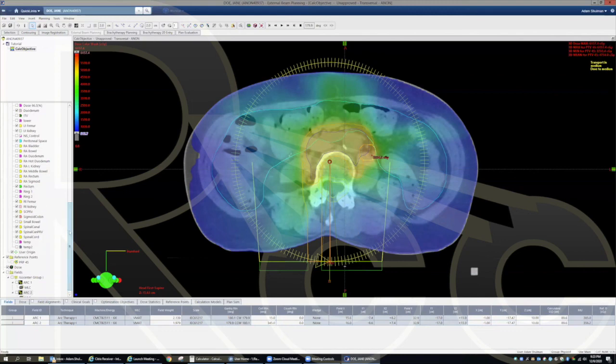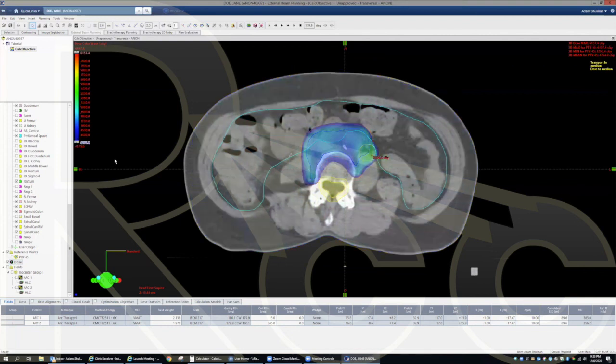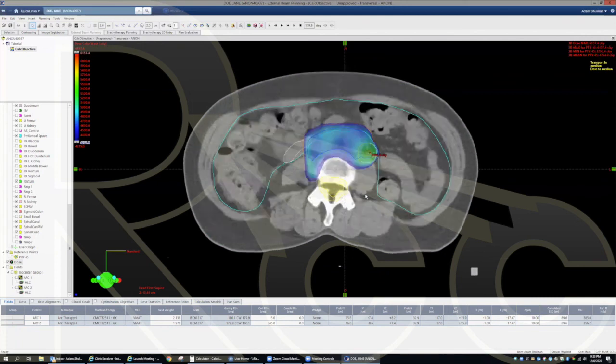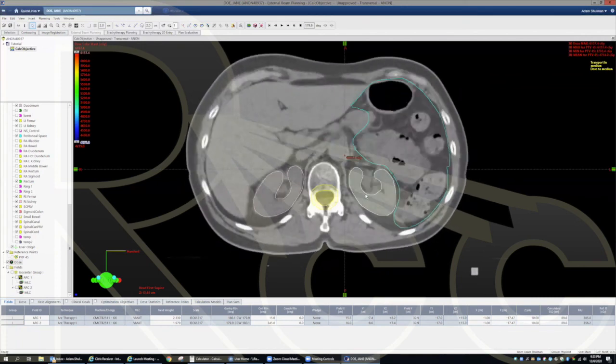Cesar is going to give a great lecture on all the contouring that we've done today, in addition to regular organs at risk contouring. So listen to those instructions, not what I've labeled here. Sometimes if we have residents that do the contouring, they'll put their initials before the contours, so you know that they're not necessarily approved clinical contours. But that might not be the reason.